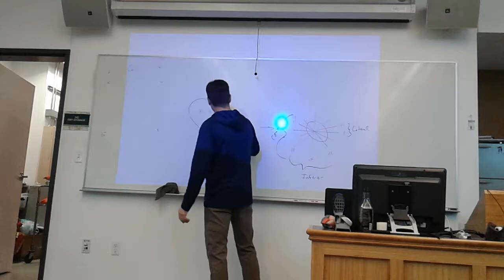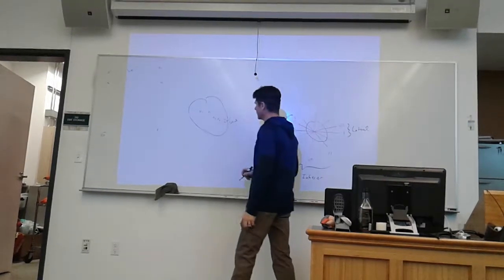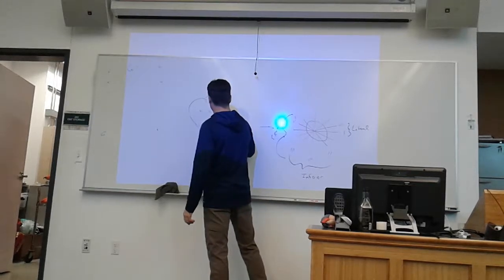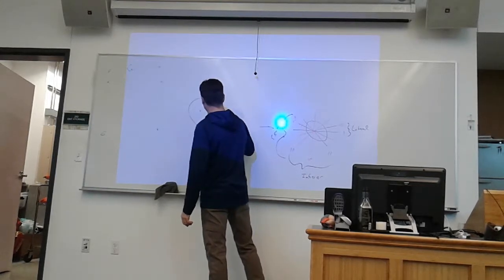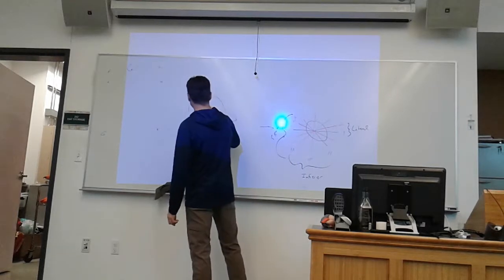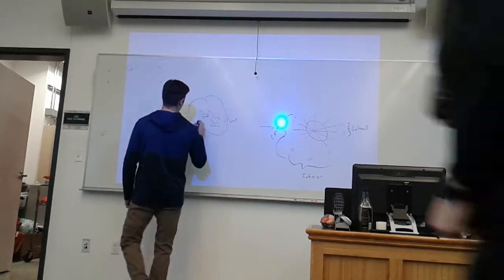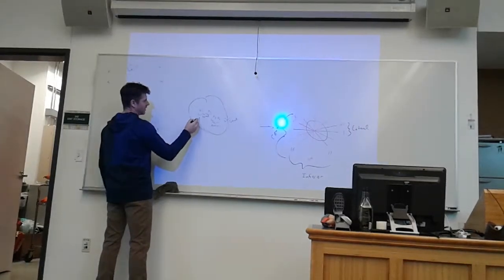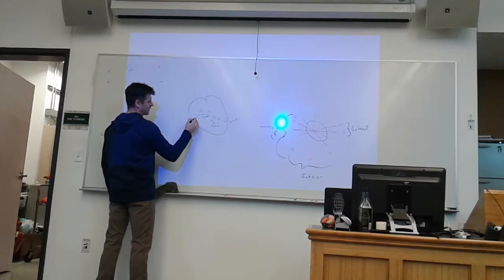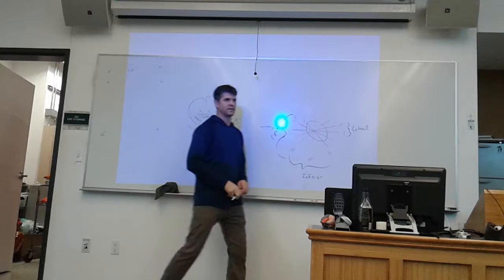So we have these two that are lateral leads, these two that are anterior leads, these two that are septal leads, and specifically V1 is also a right lead.